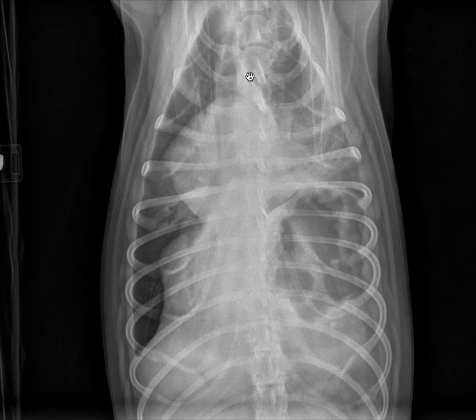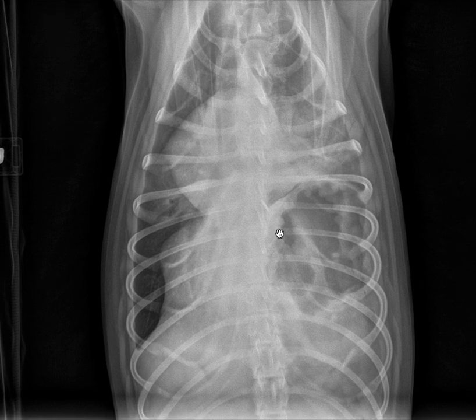On the ventrodorsal view, assessment of the vertebral column can be trickier, but in the lumbar region especially, we need to take care to look at the transverse processes. Now, to summarize our findings, once we've done a systematic review, there is a left diaphragmatic hernia with cranial displacement of the stomach, some scant pleural fluid.